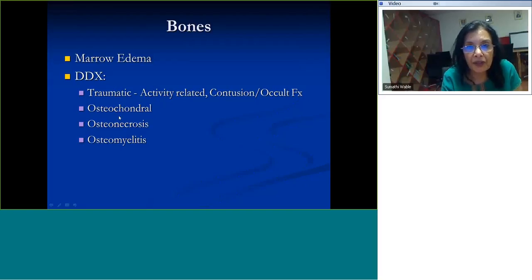You want to go on to an MRI and to evaluate the osteochondral lesions, most commonly seen in the talus, and also some of the talar bones are susceptible to avascular necrosis, as you know. And then extremity osteomyelitis in adults, especially diabetic patients, MRI is the imaging of choice.